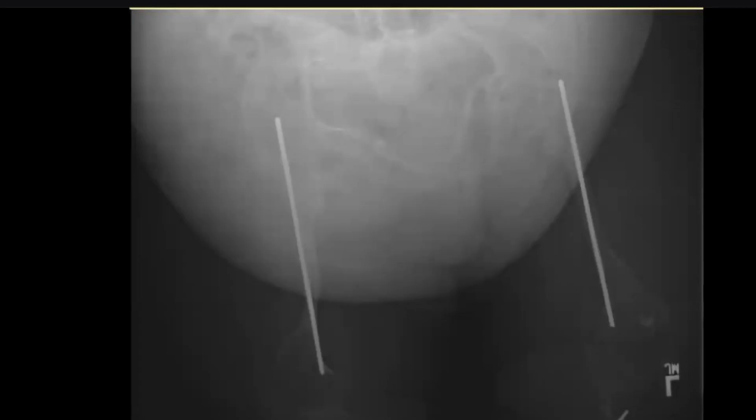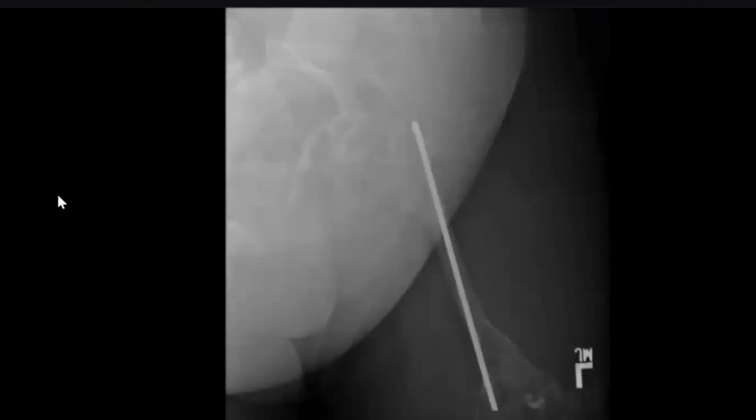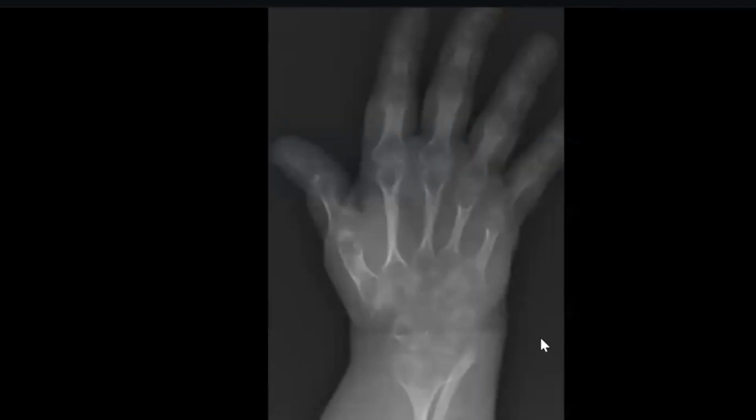It was a case of osteogenesis imperfecta. Doctor, don't talk about juvenile rheumatoid arthritis here. The problem is generalized in all the bones. Second, juvenile rheumatoid arthritis is almost monoarticular. This is a multiple deformity, gracile bone, fracture, deformity, everything, with reduced bone density. So the first possibility is osteogenesis imperfecta, less likely non-accidental injury and others. See, marked bone affection.